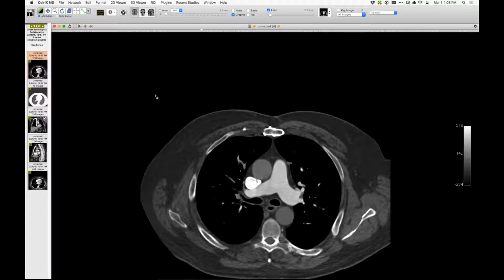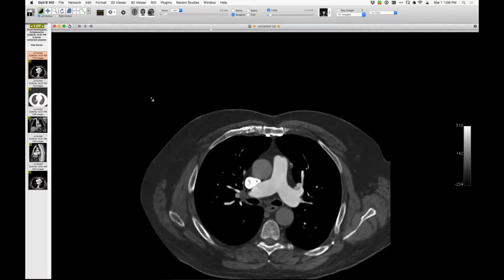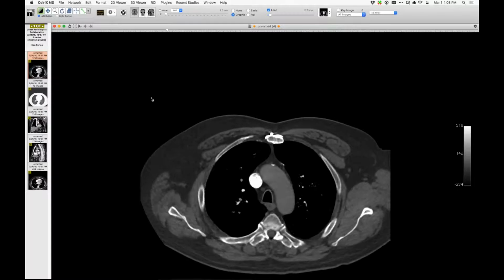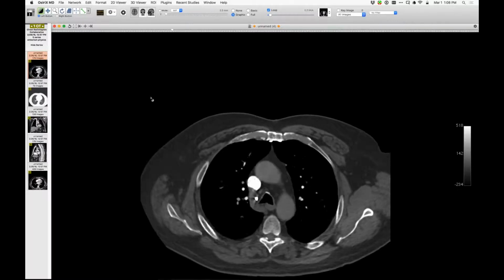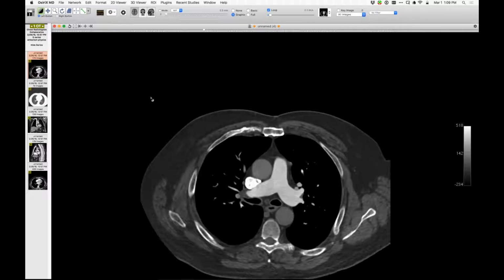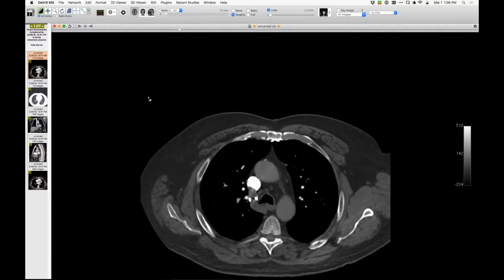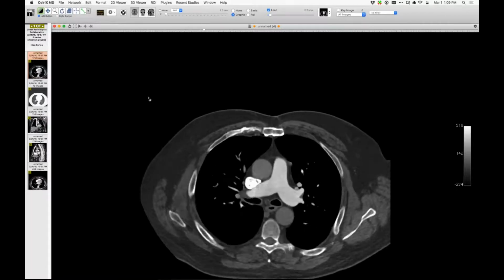In the force, you have different scanning options, but suffice it to say, for this particular one, the actual scan time turns out to be sometimes quite a bit less than a second. In looking at patients being scanned the other day, some of the patients getting a CTPA, the scan time on the console before the procedure was sometimes 0.48 seconds. So we're not even close to a second, but even below that. So here's a CTPA with a very short scan time.